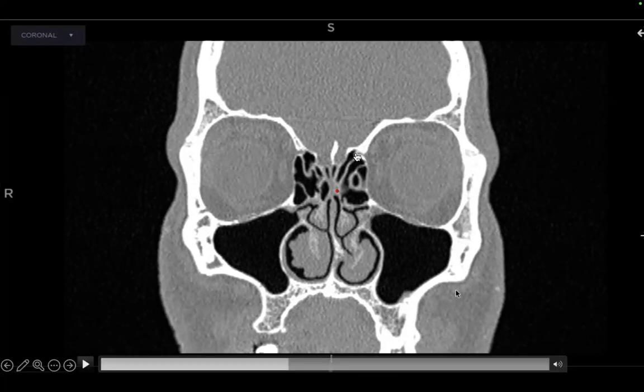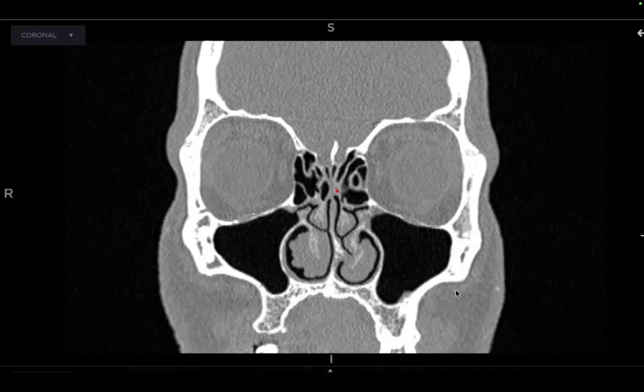And so when you look at that anterior ethmoid artery, you stop and you look at the depth of your olfactory fossa, and it won't ever be exactly symmetrical. In this case, you see the left side is higher than the right side. When you're operating in this patient, the left side, if you're a right-handed surgeon, is actually the easier side.